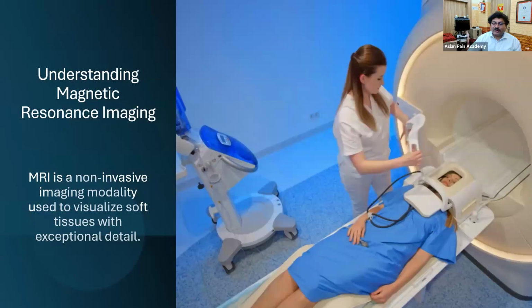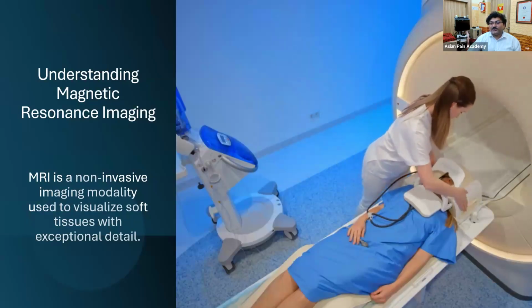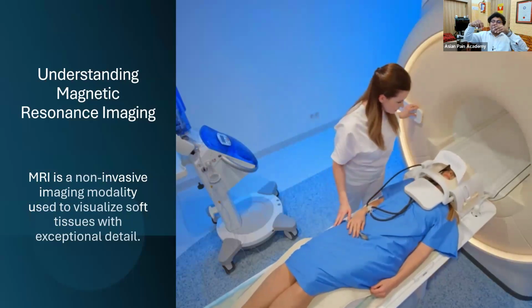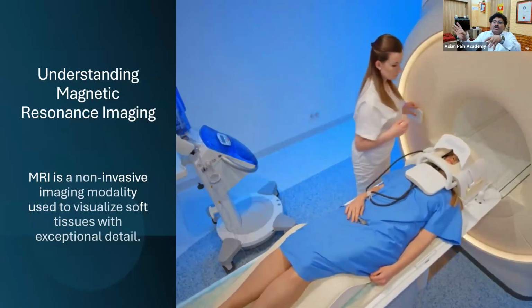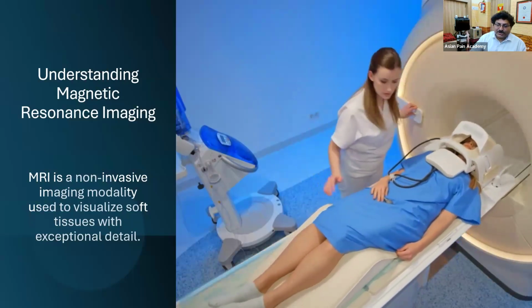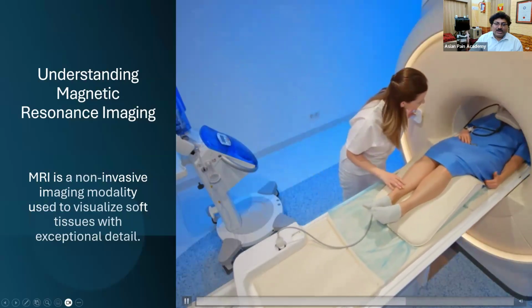But the carotid is a superficial artery, so it is easy to avoid. If you are doing a fluoroscopy guided procedure, just put pressure so that the artery goes to the other side, and put the needle in between two fingers. In fluoroscopy it is not difficult, and in ultrasound you can see it. So neither of them is difficult.